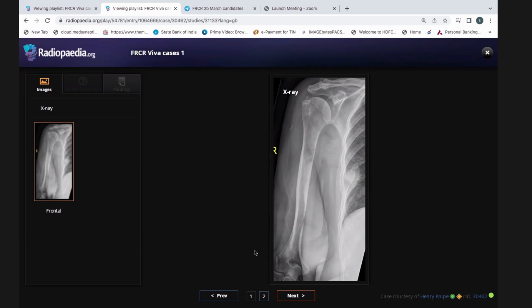I find there is a bony lesion of the right rib at the posterolateral aspect, with a wide zone of transition, seemingly expanded, with associated extrapulmonary soft tissue opacity.